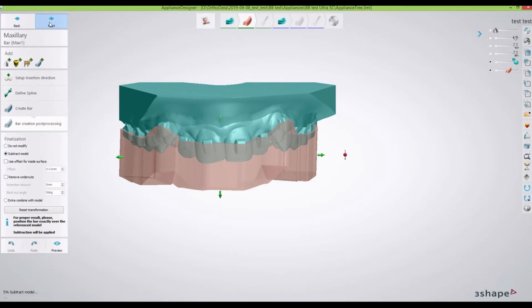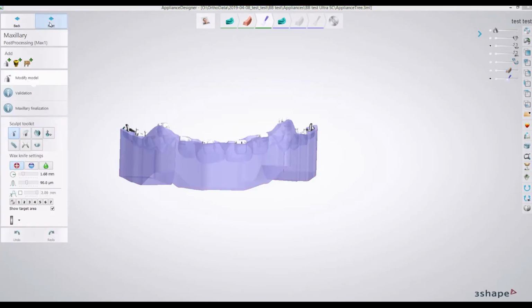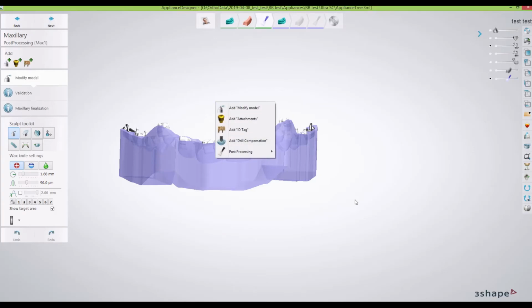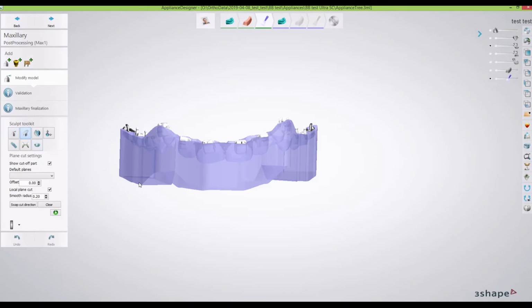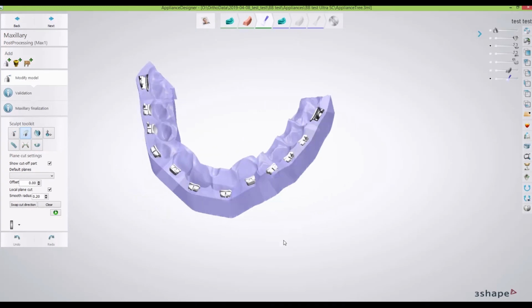And what it's doing now is just taking that model out. If for some reason you forget to subtract the model and you end up with just kind of a big blob when you're done, just go back. It'll let you redo it. Now at this point, we are a little bit too thick, and plus we're not flat. If you want to print this, you wouldn't be able to print it flat on your printer. You'd have to put some supports, and you don't want to do that.